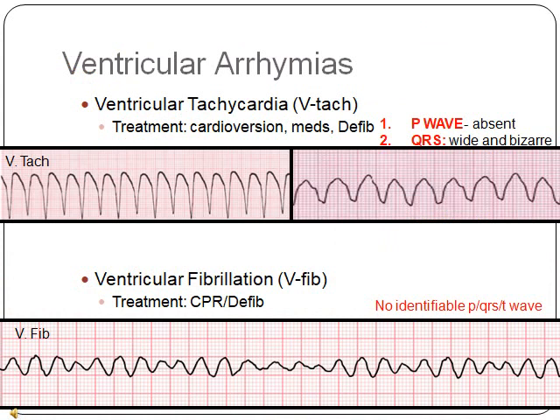So here are ventricular arrhythmias. Before we talked about atrial arrhythmias, now it's ventricular arrhythmias. If the ventricles are taking over, like the heart's at its last stop, they're called lethal arrhythmias. They're much more serious. Ventricular tachycardia.